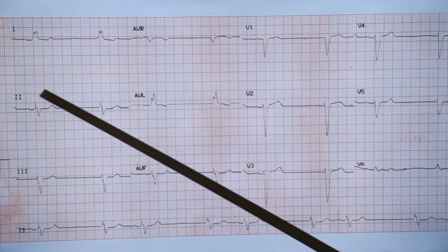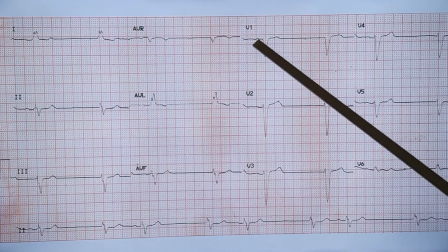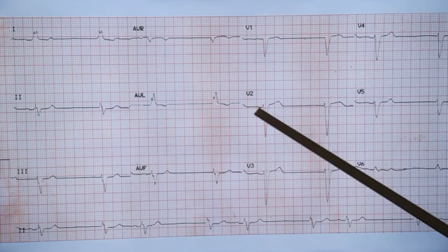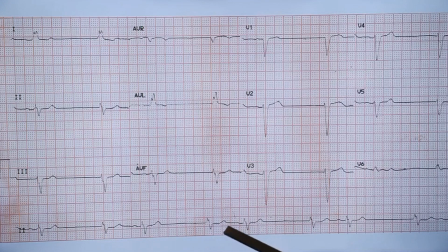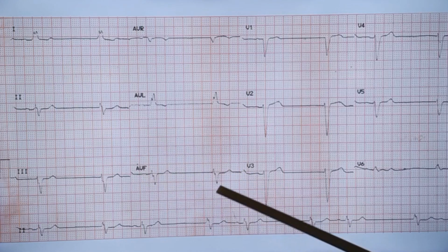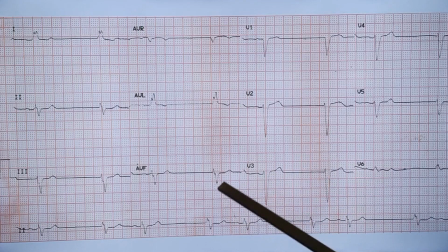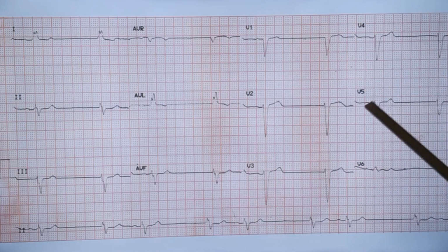So this is probably the sinus beat and this is probably the escape beat. But with only two beats seen in a given lead, you can't be completely sure. You have to look at the rhythm strip. Similarly, here a P wave is seen, and here there is no P wave. So of the group beats, you are seeing these two beats together in the ECG, except the rhythm strip. So you can't identify the abnormality from the regular part of the ECG alone.